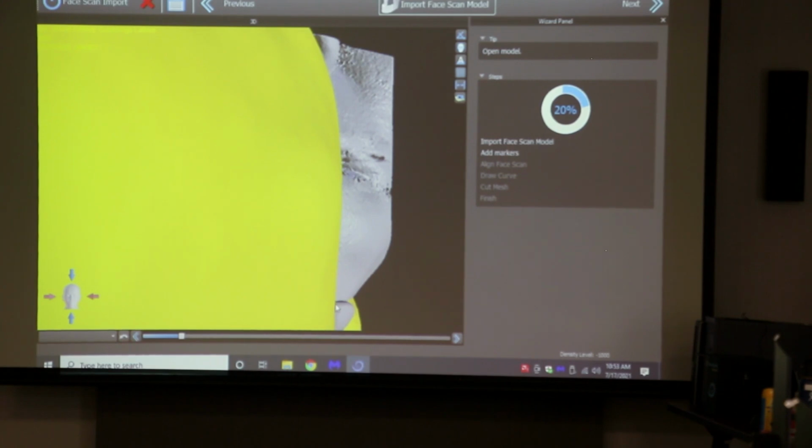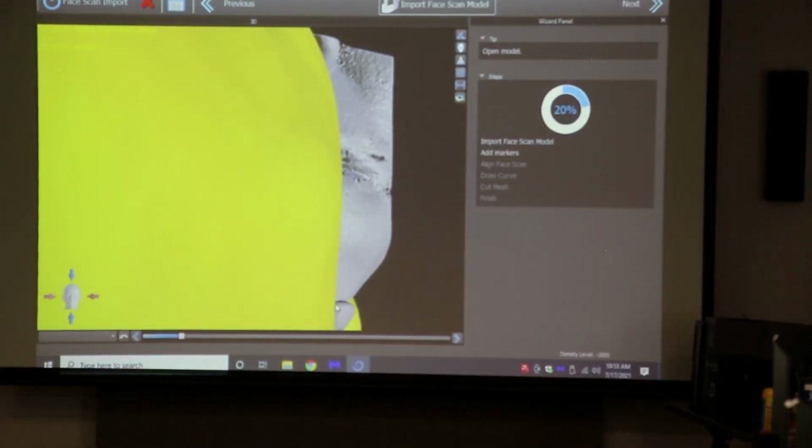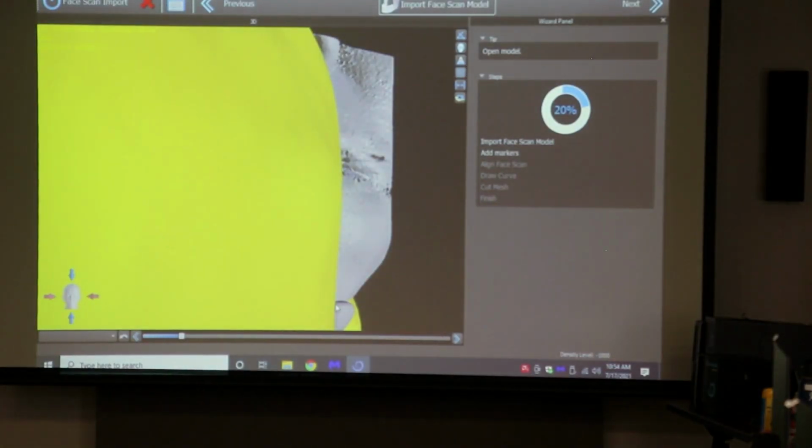So what I need help with is when he brought in the file of the upper and lower. Were you able to click there at all? I clicked on file, but I hadn't done anything yet. You already clicked the slider. Yeah, I kind of messed around with it. Now you just click file and import. Import, yeah. This one here.